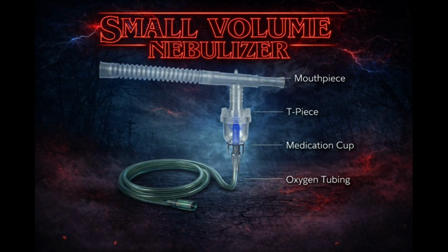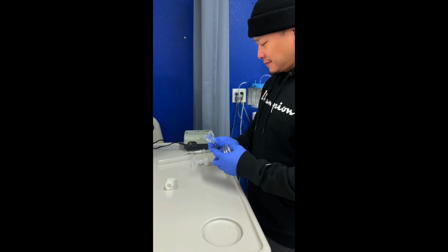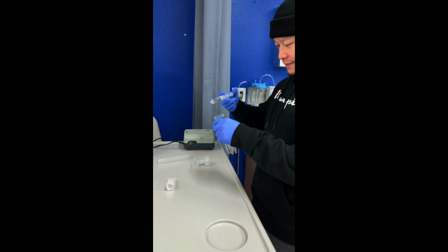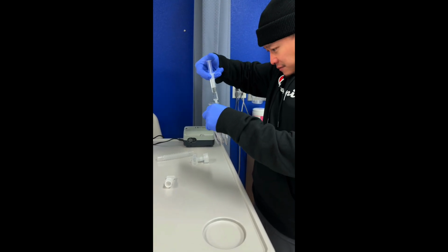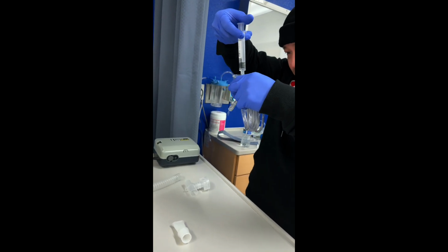SVN setup. Now I'm going to explain how to properly set up a small volume nebulizer, or SVN. First, I gather all required supplies, which include the nebulizer cup, mouthpiece or mask, oxygen or air tubing, and the prescribed medication. I open the nebulizer cup and add the ordered medication, making sure the total fill volume is appropriate, usually 2 to 5 milliliters, depending on the medication and dilution.